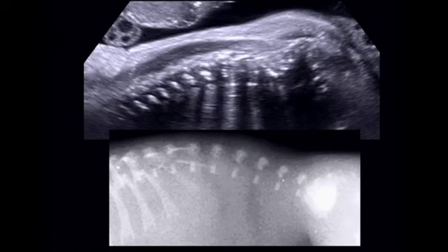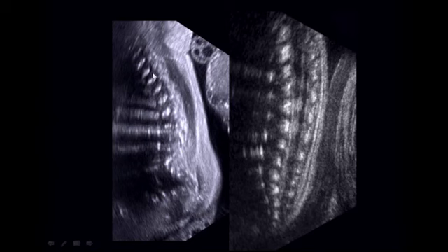So what does that look like on ultrasound? The ossified vertebral body is echogenic, the intervertebral disc is hypoechoic. So I've turned this ultrasound around to mirror the appearance in this radiograph, and you can see there's your flattened vertebral body, just as you see here, and your increased intervertebral disc space, just as you see here on the radiograph. Here's another example. There's a sagittal of the spine.